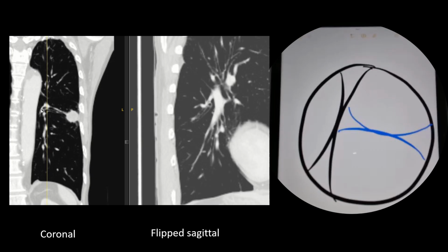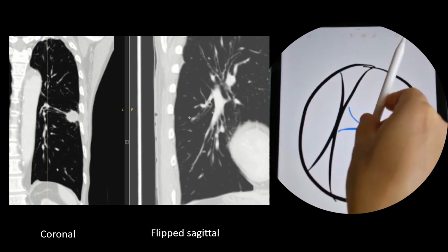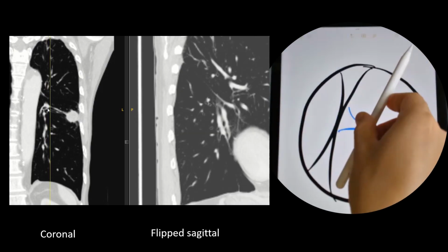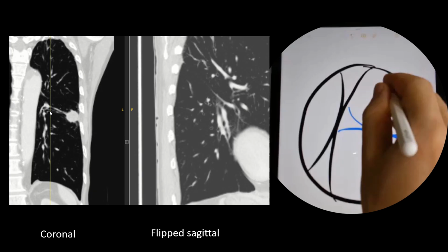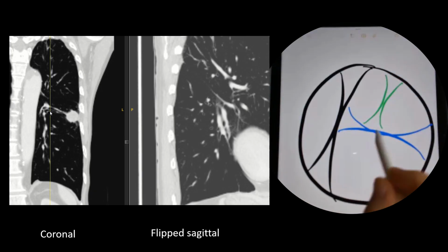As we continue on the coronal, when we see this configuration at the top, this means that the hole actually splits in this direction, left and right. And if we're not sure, we can simply follow the hole on the sagittal view where we see that it splits in this direction and exactly at the same angle as we expect to draw. And so we can draw it like this. And we know that we have to follow the right hole.